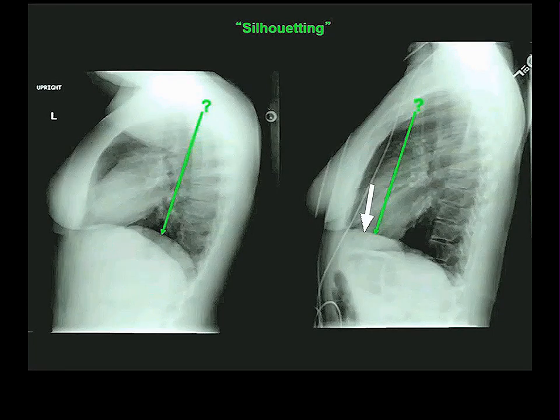You can see the two hemidiaphragms as separate structures. You can see it here. And here's the other hemidiaphragm. On the left picture, here's one hemidiaphragm. Here's the other. They're not sitting at the same height, typically. But the question is, how do you know which is which in this image? Look at this hemidiaphragm. Let me trace it. I can trace it, and then I can't trace it anymore. Let's take a look at the other one. Trace it, all the way to the front.